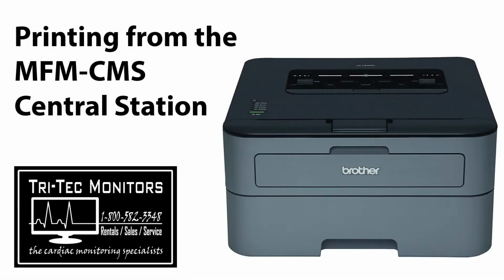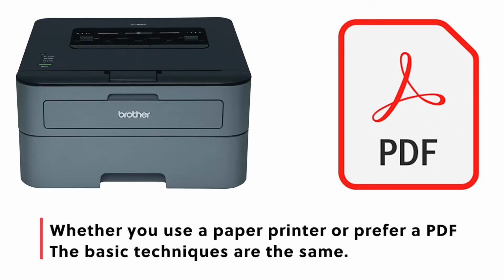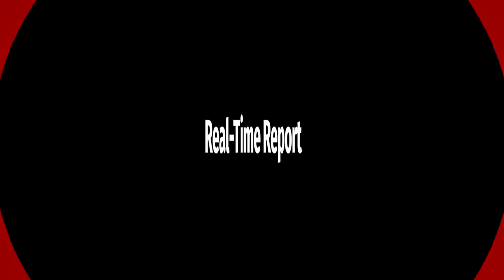Today we are going to learn how to print cardiac strips and vital signs reports from the MFM-CMS Telemetry Central Station. Whether you use a paper printer, or prefer PDF electronic documents, the basic techniques are the same.